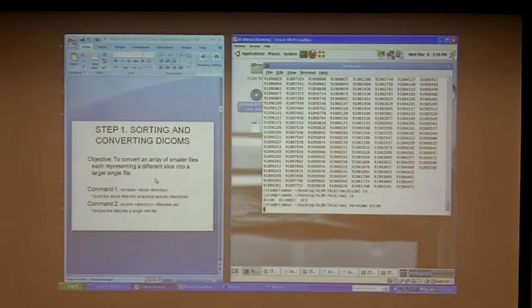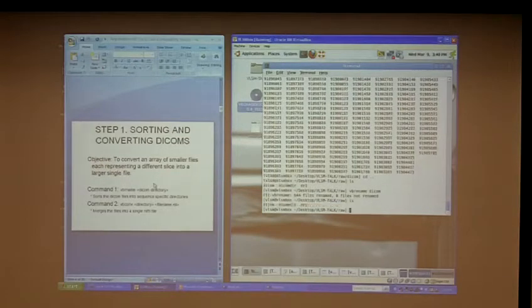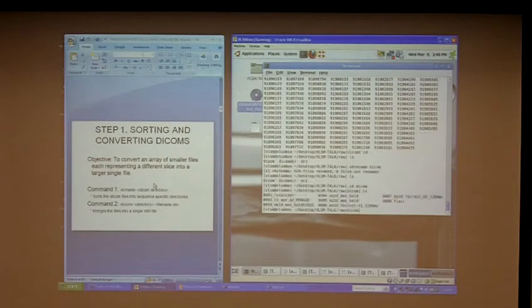Yes. So how does the program know, having looked at this big set of folders, what is what? It's reading the headers from the Dicom files themselves, and sorting them into the different sequences. In this particular protocol, I know that we've run a couple of functional runs. There's FLAIR, there's MP-RAGE, and a couple of other sequences. But if we now go into that, everything's been sorted into the different sequences of files that we have.